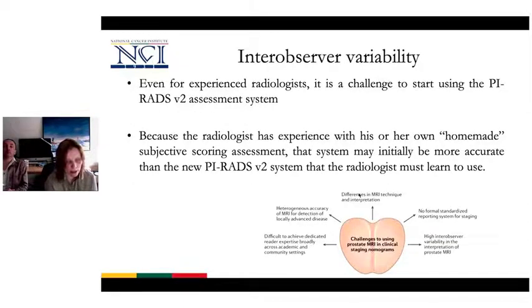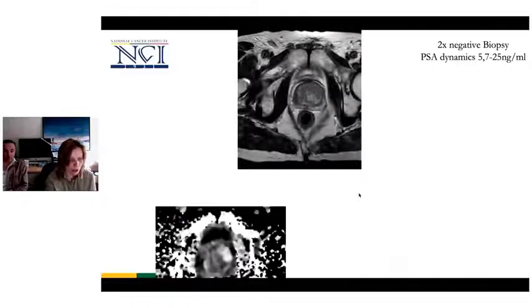What we have to say is that in PI-RADS evaluation, we have a great inter-observer variability. In order to be an experienced radiologist who evaluates those images properly, we have to look at quite a lot of images. It is recommended to look at not less than 400 images and to do it every year. And of course, at the start, it is easier when you have the possibility of double reading. I will show you some examples.